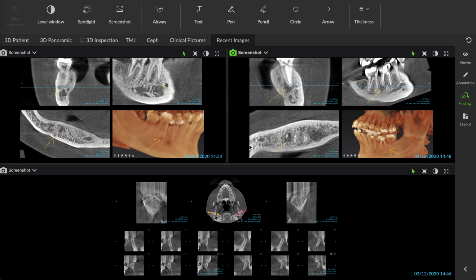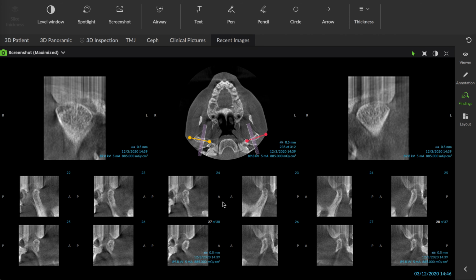And then, because she thought she had some TMJ, we went ahead and just used the 3D to do a TMJ study, where you set up the slicing through the condyles and the articular head and look through it. I didn't see any adhesions. I'm not seeing any damage necessarily that I can diagnose. And after we did the cold test on that tooth number 30, she was like, yep, that's where the pain's coming from. So we stopped looking at the TMJ.